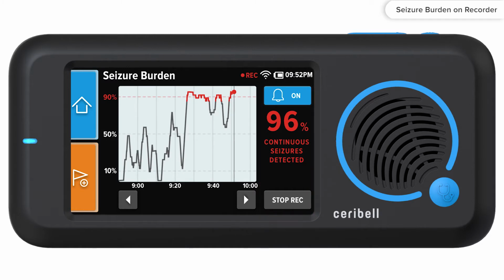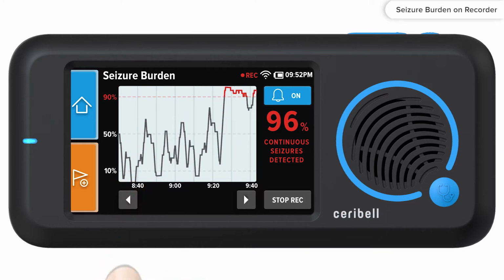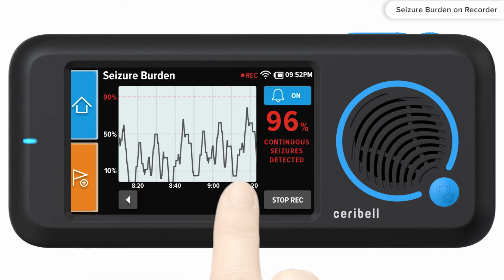The seizure burden trendline allows you to see how the seizure burden has changed over the last hour of the recording. You can also scroll along the trend line if you would like to see the seizure burden from earlier in the recording.